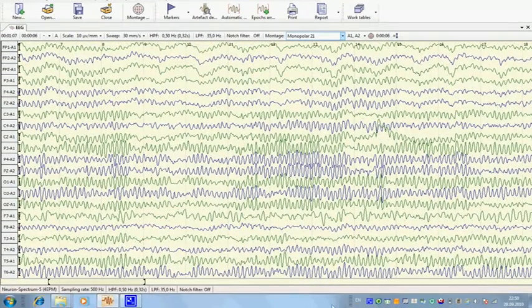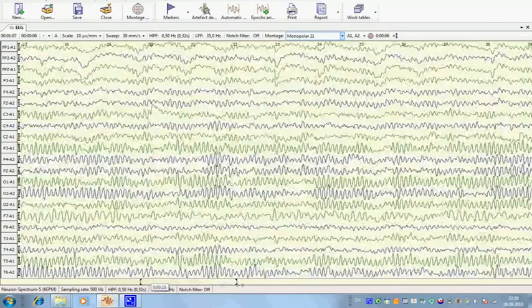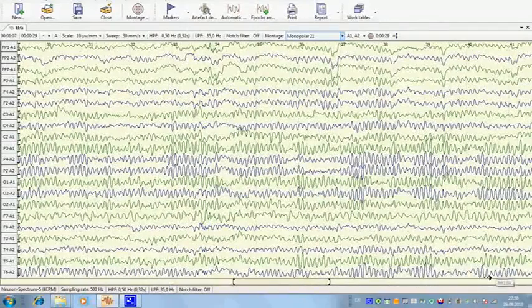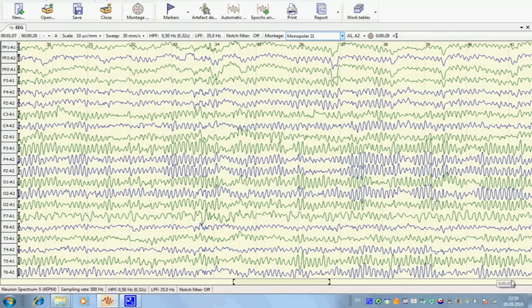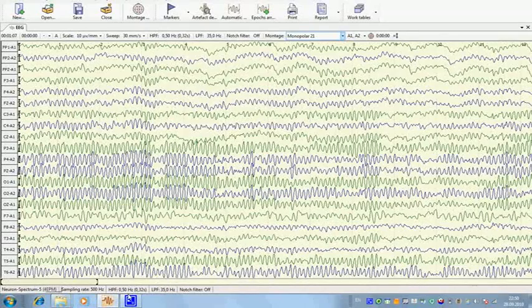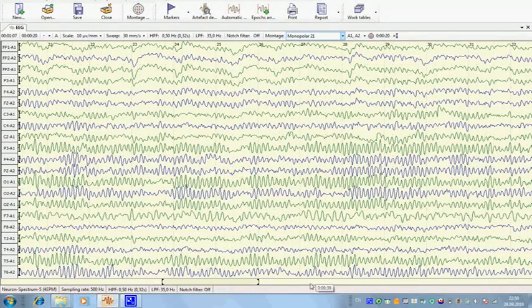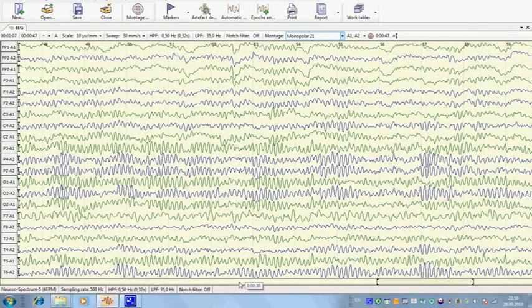Under EEG traces, you can see the navigator. In the navigator window, you can see the whole EEG examination on one screen. You can use the navigator window to move through EEG. Using the navigator, you can go to a selected time with only one mouse click.